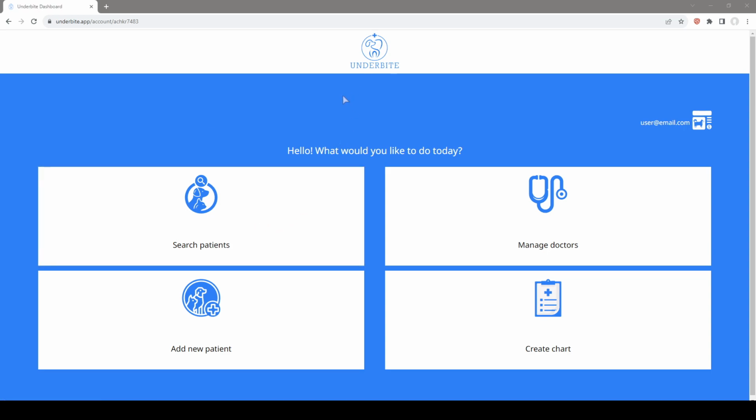Today, I'm going to take you through a brief overview of the features that we currently have and how to get started on our platform. So to start, once you sign up, it is very simple. You sign up with an email and then a password, and then you put in your clinic information. And then just like that, you're signed up.